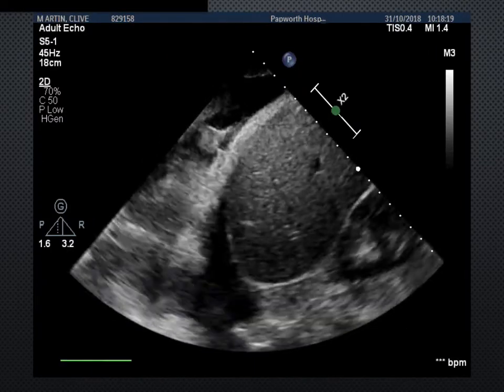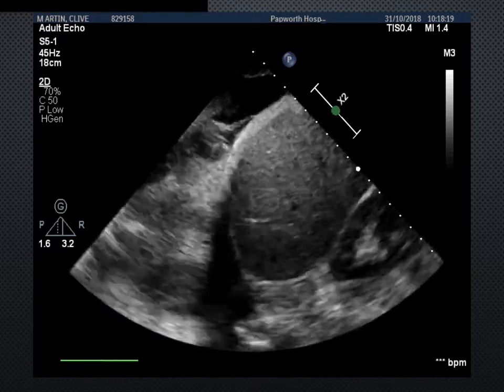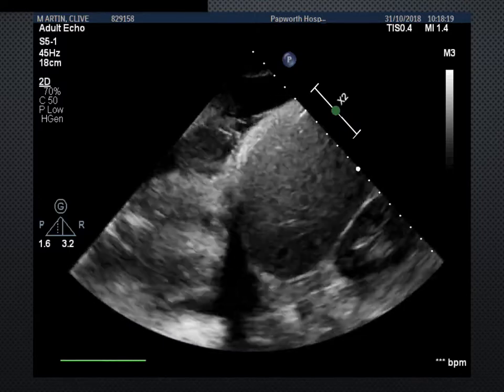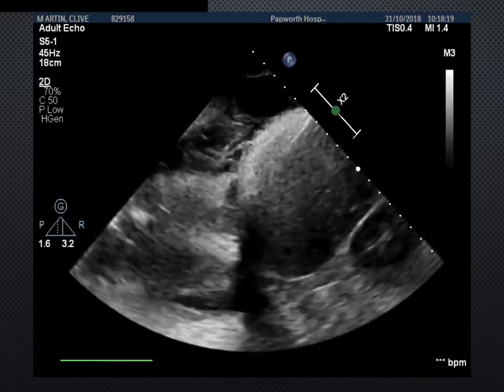And then even long term, we're back to that backwards image that I was showing you before. Although I think we can all appreciate that the excursion in this case is much, much better. The adhesions, or the septations have turned into adhesions in this case, are much greater as well.